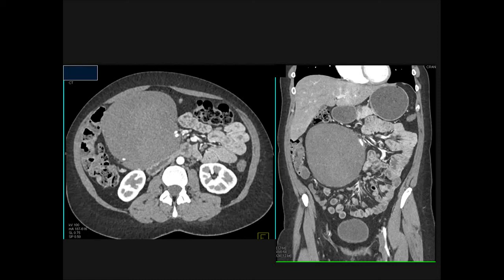A large duodenal GIST tumor would work well. I could go with lymphoma, but with one solid mass and seeing nothing else, I'd have a problem with that. You can get big mesenteric masses with lymphoma, but I'm just not that excited. Is this a hematoma? Well, it's not high density. It's not low density. It's large, right in the mesentery, has mass effect. I would not consider hematoma.